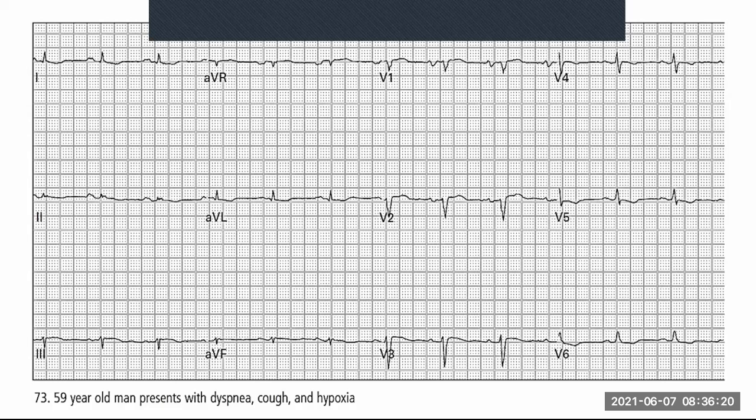Let's look at the rate. The rate we've got, let's see from here, 1, 2, 3, 4, 4.5, 5. So we're getting about 70 beats, 68 beats per minute. Right? So it's relatively normal. It's not a brady, it's not a techie. Right. Now let's look at each zone.